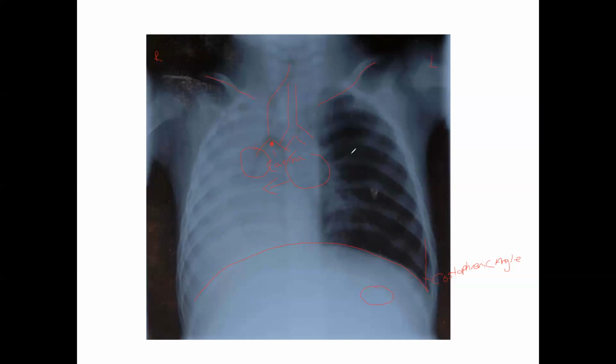So on this particular chest x-ray, make sure that the patient is oriented appropriately. You look to see their clavicles. You also want to be careful, and you can see that this patient's got their arms held out to the side a little bit. You can see where the head of the humerus is and how their arm would be positioned. Having their arms positioned as such helps to move the scapula in the back area, because you can see some scapula shadow on there that could make you inadvertently think there might be a pneumothorax or something to that effect.